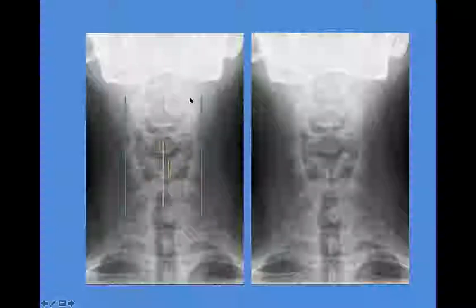So these are our facet joints, and we're looking to see that the facet joints are lined up and that the lateral border of the cervical spine is lined up. Then you can run your eyes down the spinous processes. So we can see them here on the right, where the orange line isn't obscuring you. You can see the cortex of each spinous process en face, right?